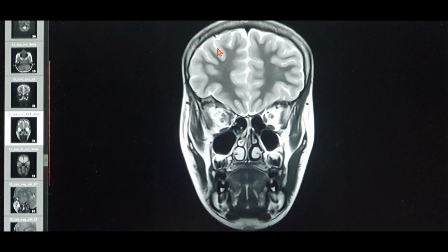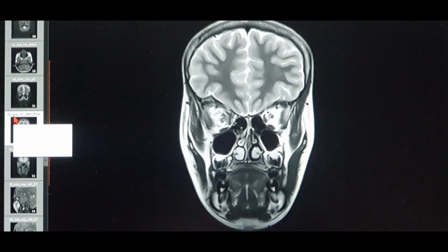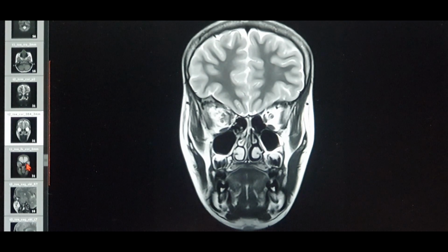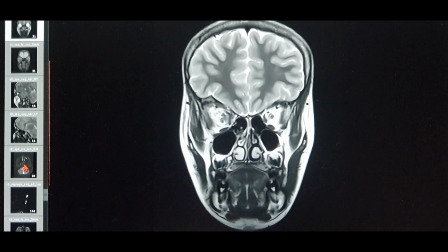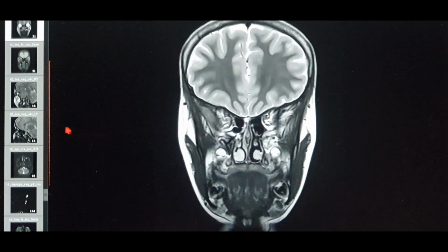Now, say for example, the patient has a head trauma, with some loss of consciousness, or is semi-conscious, with brain inflammation. Now remember, listen carefully to the words I'm using here. If he has inflammation in the brain, then just remember the inflammation is always dark on T1. So this is a case of T2, right?